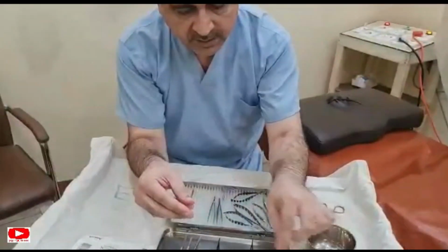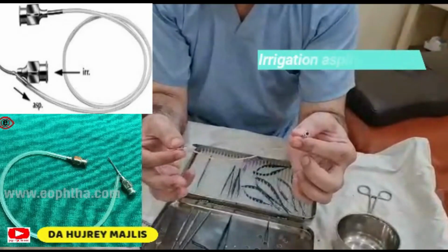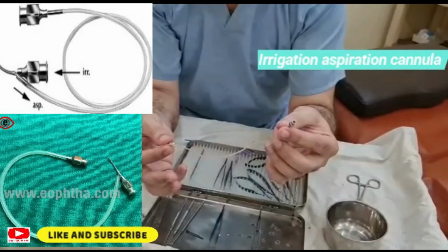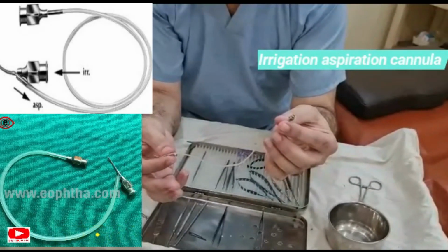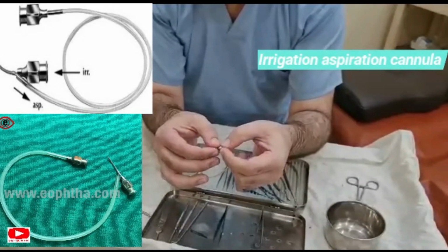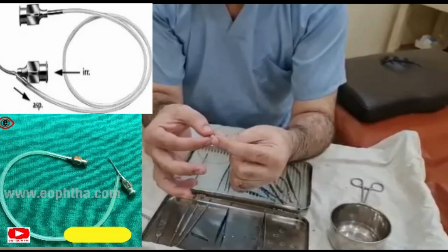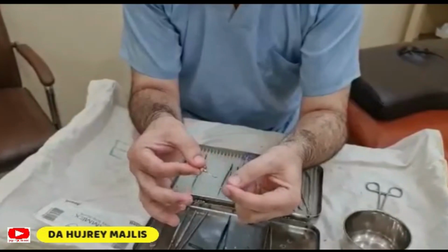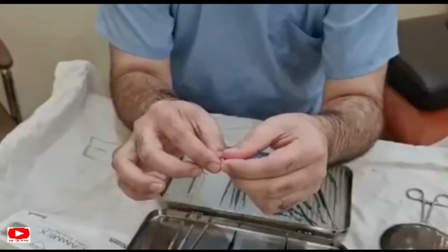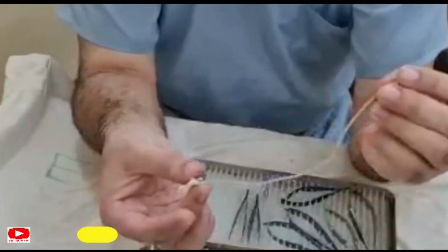So that is the eye speculum, and this one is the irrigation aspiration cannula, or we call it the Simcoe cannula. We use it in cataract surgery. This part we connect with the drip set, where the fluid goes into the anterior chamber of the eyeball, and this part we connect with a disposable syringe, by which we aspirate the fluid from the anterior chamber.